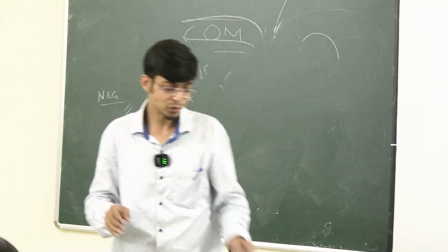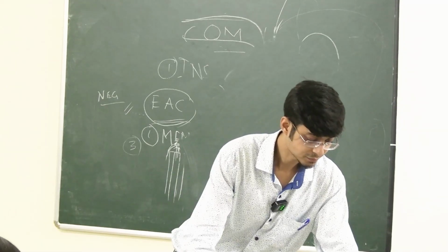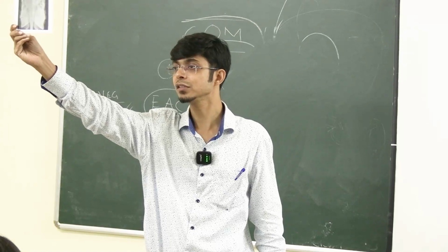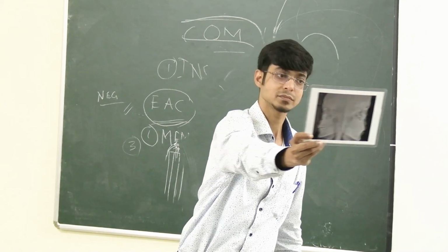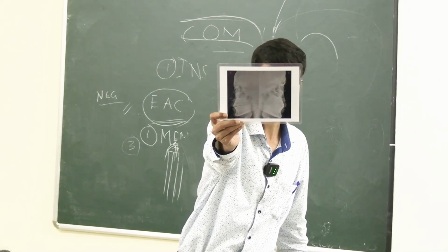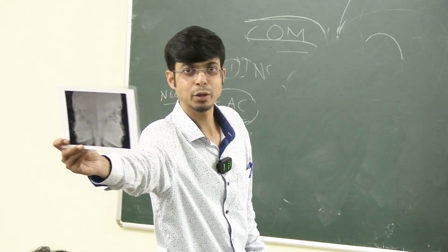Okay, so try to think and answer. So now this one I think everyone knows. Can you understand this one? I'll show. Look at it a bit. Any particular thing you can appreciate?